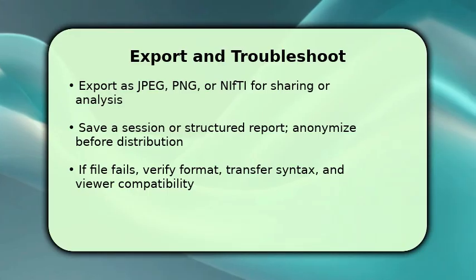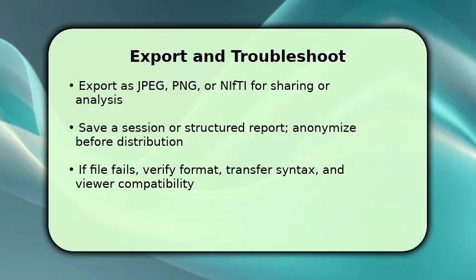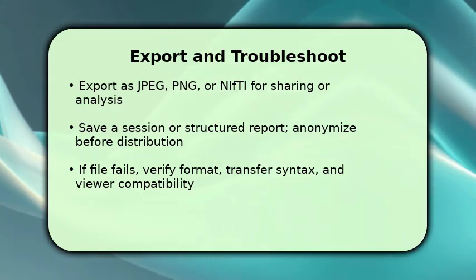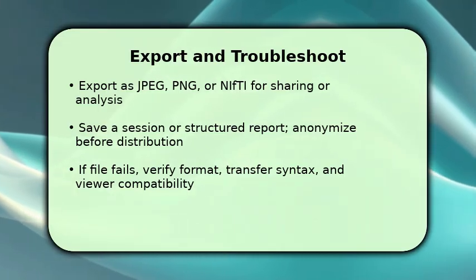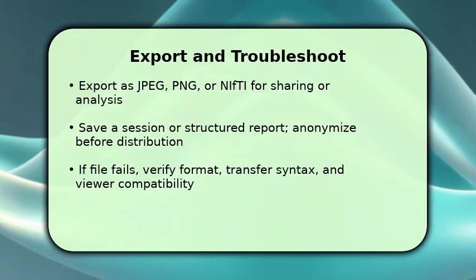If the viewer cannot open the DCM, check the file's transfer syntax and whether it's a single frame versus multi-frame DICOM. Make sure your viewer supports that profile. If problems persist, try another viewer or convert with a command line tool to reveal file-level errors.